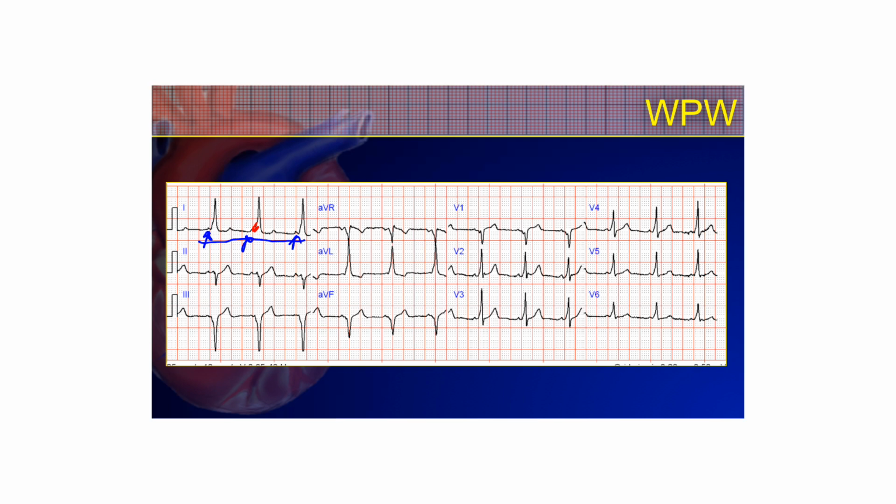It's sort of difficult to identify here because the QRS complex doesn't look too wide, but it's certainly wider than it normally would be, because those ventricles are depolarizing much earlier than they should be. So look over at V4 and you can see that classic triad pretty well too. Shortened PR interval, slurring upslope. That delta wave is much more apparent here. Slurring upslope of the delta wave and widening of the QRS complex.